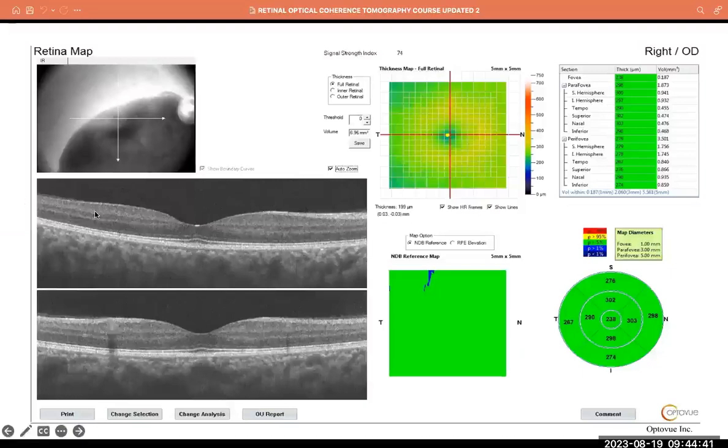See the nerve fiber layer to the other side is thinner. Even the next one is a bit thicker, but the right is thickest. So this is the bundle from the nerve, the papillomacular bundle. So it's thick. If you had extended this image to the right, you would have seen the optic nerve.